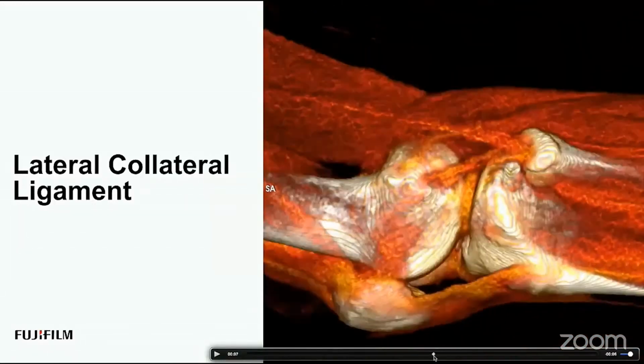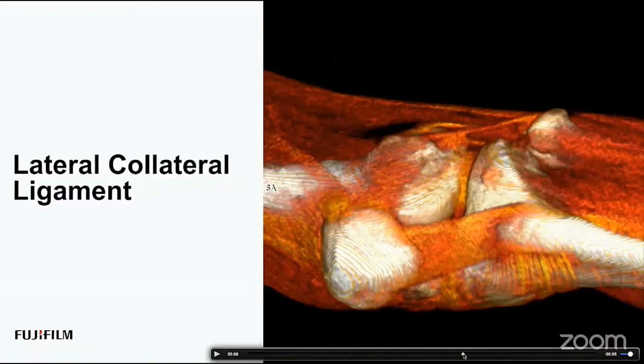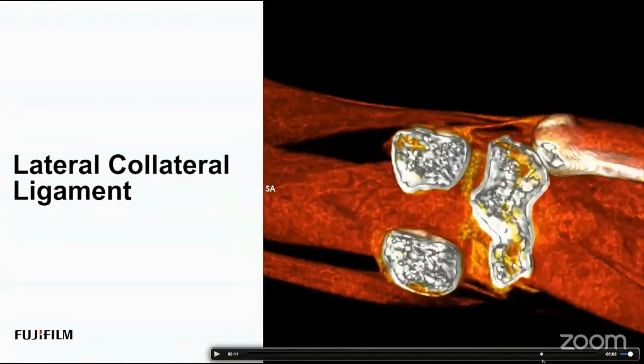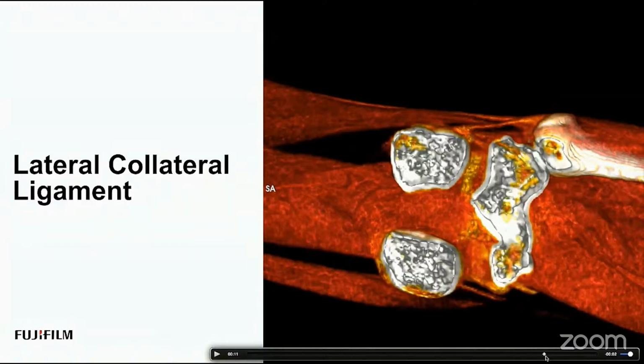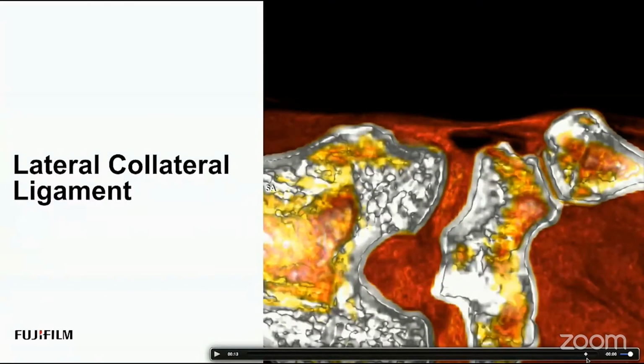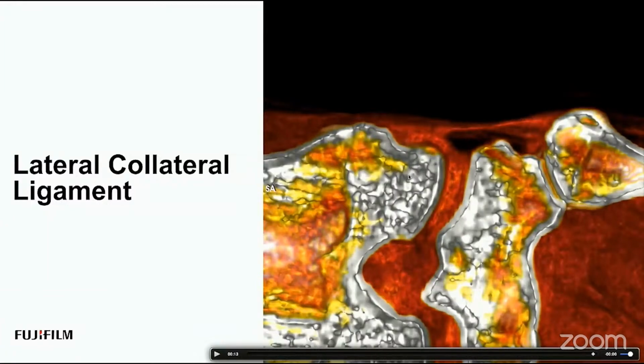CT, and let's cut the anatomy how it should look on the ultrasound. So let's remove a few layers here, and let's cut into the femur just because we can. Have a little bit of fun with our radiology depictions here. All right, so we're going to zoom in, and we should see this surface.